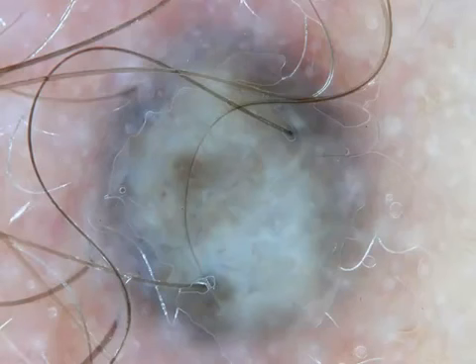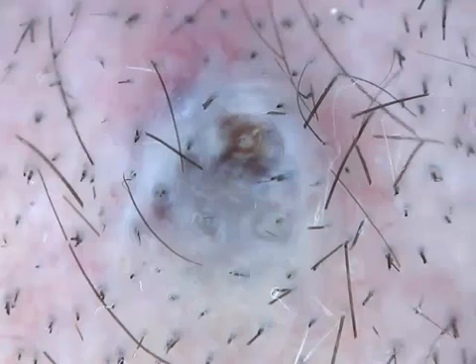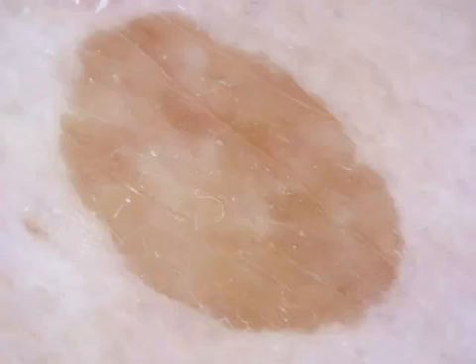This, of course, is structureless and blue, although it's not homogeneous. There are different shades of blue and gray, so it's structureless and not homogeneous, but of course the diagnosis is blue nevus. Here, clinically and dermoscopically, is a lesion that is also structureless and blue. In this case, it's not a blue nevus, although it could be one. It's an important differential diagnosis. In this case, it's a melanoma metastasis, which is a differential diagnosis of structureless blue lesions.